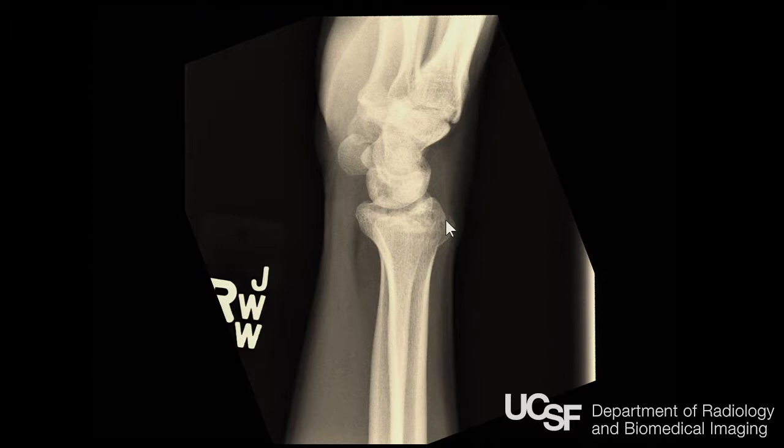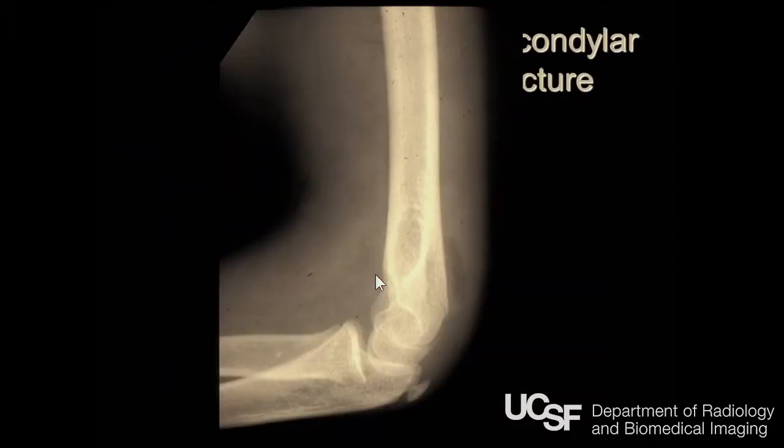Sometimes it's hard to distinguish this from Lister's tubercle, but look for a buckled cortex. That's the compression side of the injury. Usually people fall on their palms because they protect themselves, and they may buckle the cortex, and you might not see the volar-sided tension injury. So look for the buckle fracture. This bowed pronator quadratus fat pad is a clue that there's something wrong, and that's what's wrong.